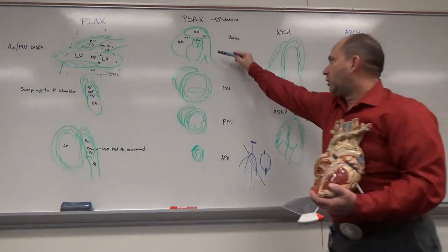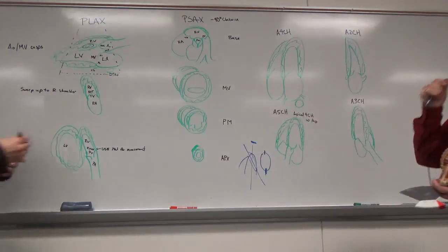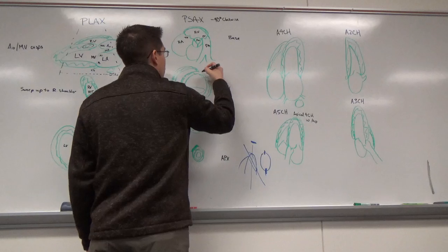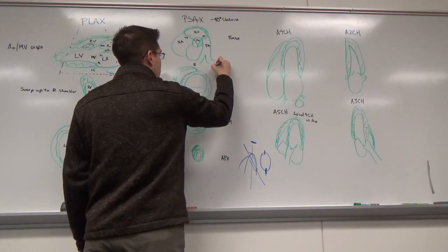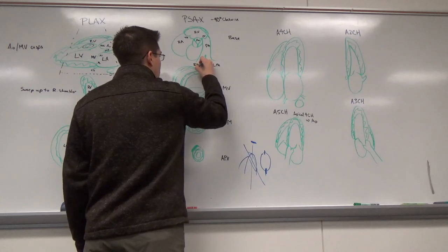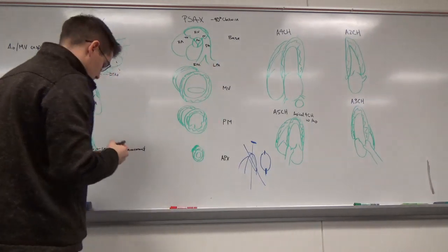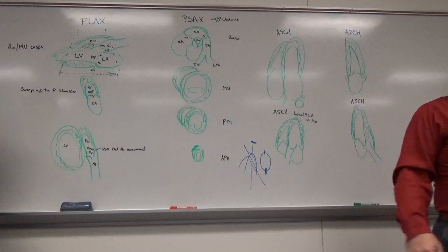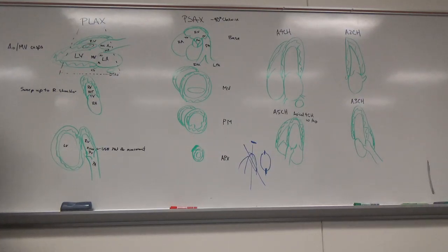Okay? And then in this one, what is this here? So that's the main pulmonary artery, and then it bifurcates. And which side is what? Right. Okay, we've done this one before, so we've got the right going towards the right side of the heart, which actually wraps around the underside of the heart, and the left goes out right away to the left lung. Are these the lower ones or the upper ones? So those are pulmonary veins. These are pulmonary arteries. Okay. There's 4 of those.